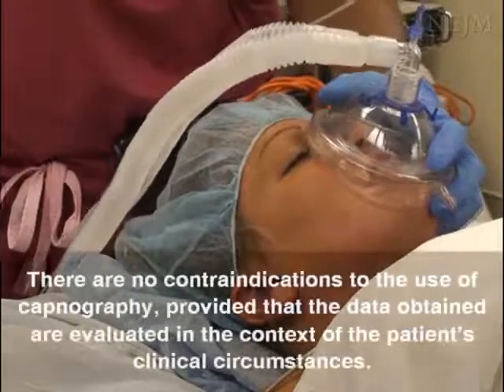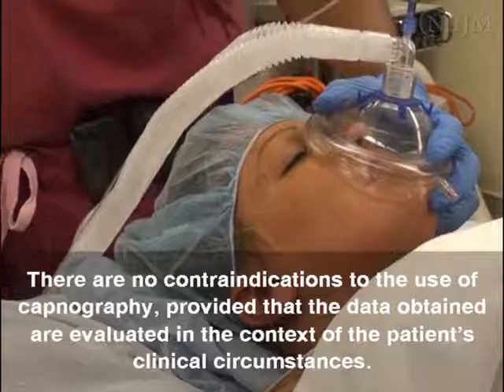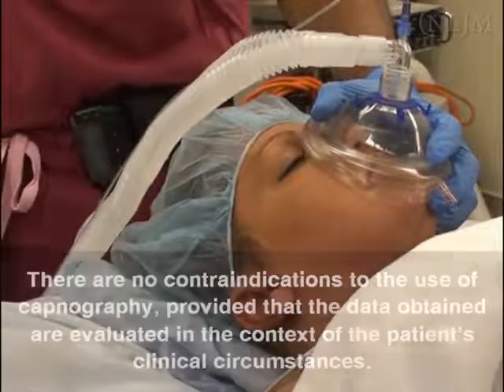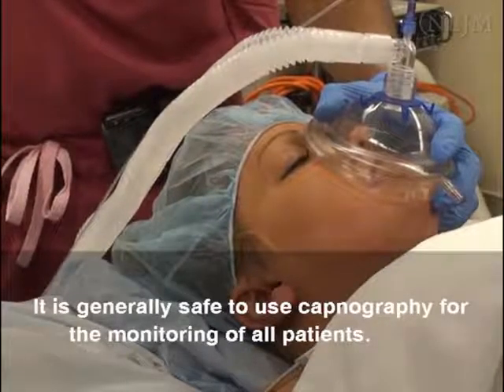There are no contraindications to the use of capnography, provided that the data obtained are evaluated in the context of the patient's clinical circumstances. It is generally safe to use capnography for the monitoring of all patients.